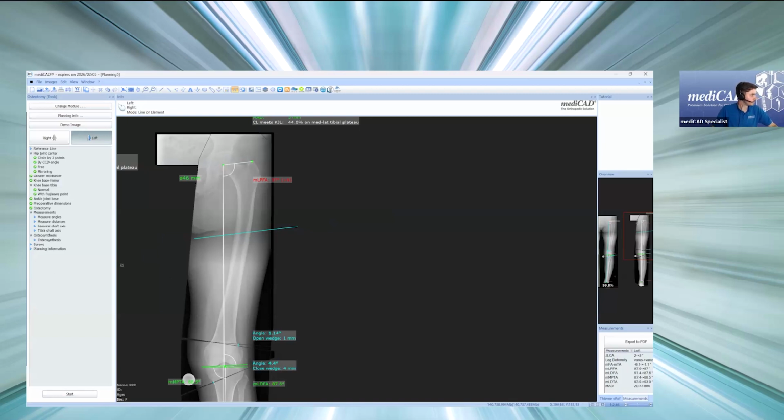So yeah, I think I covered most of the main improvements here. Obviously, there's a lot more minor stuff, also bug fixes, as I mentioned before in the beginning. Once we release the application, you can have a look at the full changelog for every improvement. And maybe if you missed it, as I mentioned in the beginning, the update is planned to release on this Friday, August 8th.